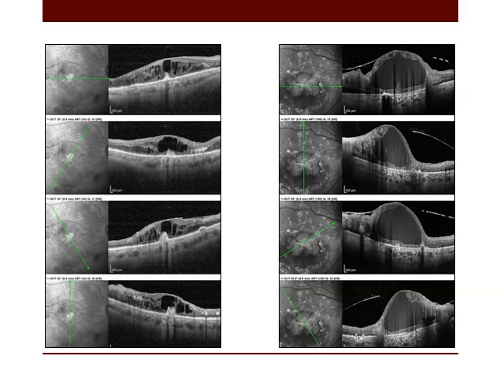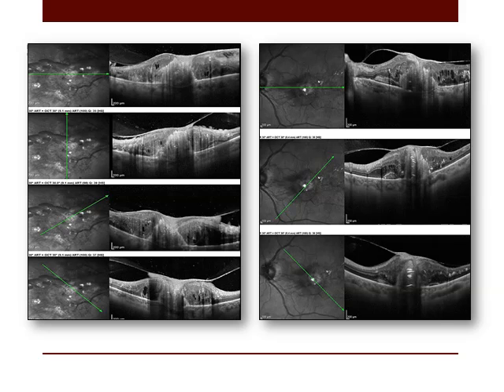Also, the choroidal thickness plays an important role in the prognosis. A thin choroid carries less favorable prognosis. Marked disruption of the architecture of these retinal layers, foveal plaque of hard exudation, very bad vitreomacular interface. This is a very bad prognostic patient. Similarly in here.